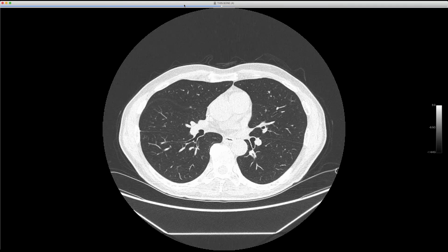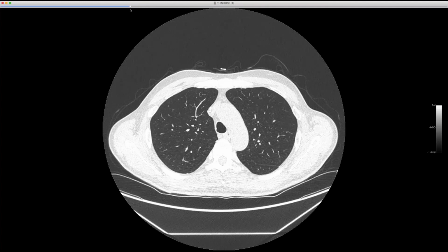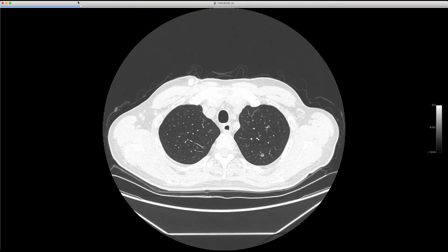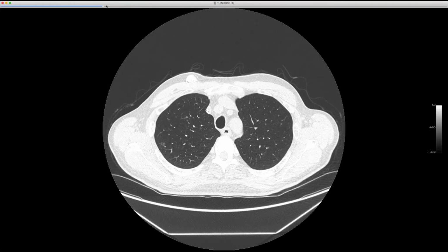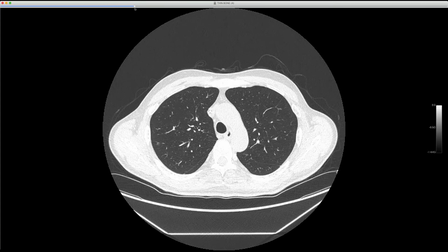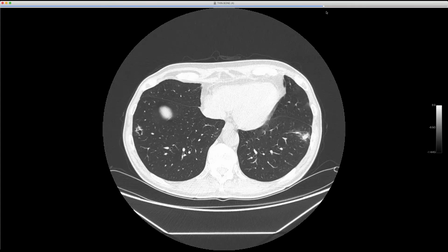So something strange. So had a VATS biopsy of one of these up here, and this is all metastatic urothelial carcinoma. And I mean, we don't see a lot of mets to the chest, but I sure have not seen cystic metastases from this particular tumor. And I was still taken aback just how upper lung predominant it is, with just this one in the lower lobe.